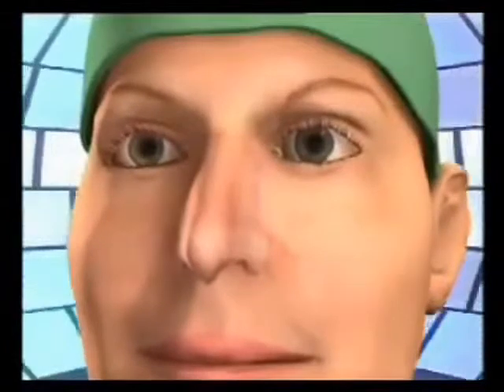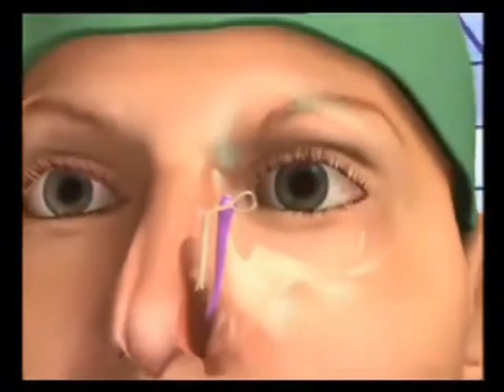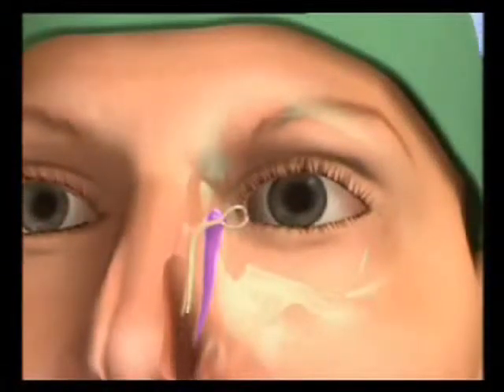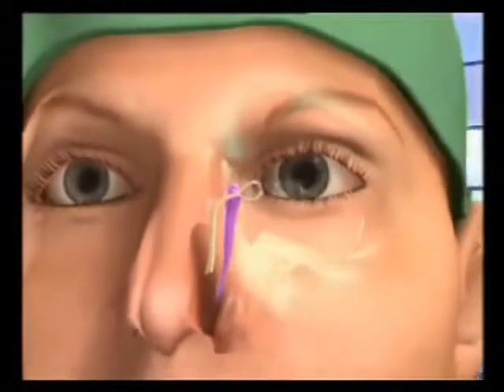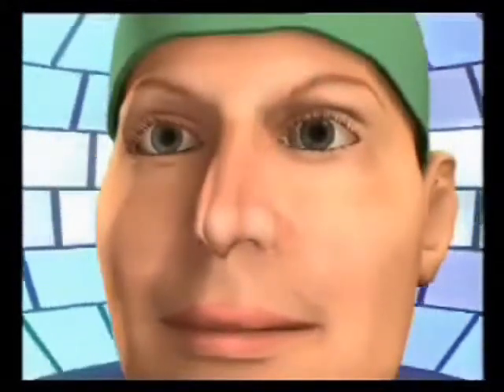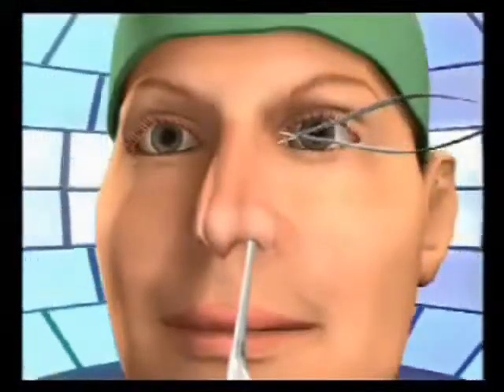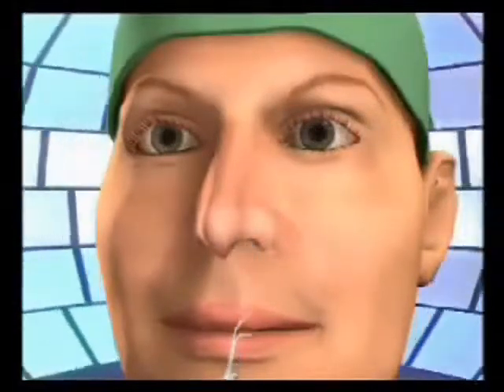Transcanalicular and endonasal laser-assisted dacryocystorhinostomy offers a series of advantages. It does not leave a skin scar. Disinsertion of the medial canthal tendon or incision in the orbicular muscle is not required. And there is no injury to the angular vessels or bone fracture. Furthermore, bleeding and intraoperative and postoperative pain is minimal. Surgery time is shorter. General anesthesia and hospitalization are not needed. Postoperative morbidity is low, and resumption of daily activities is rapid.